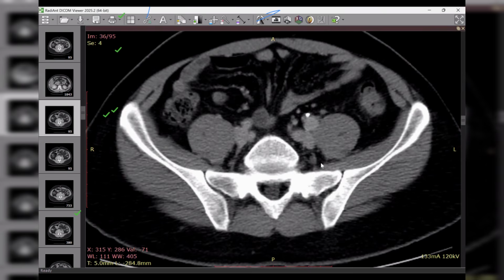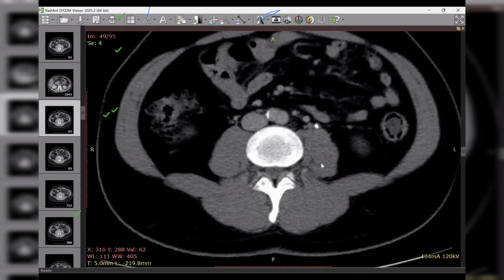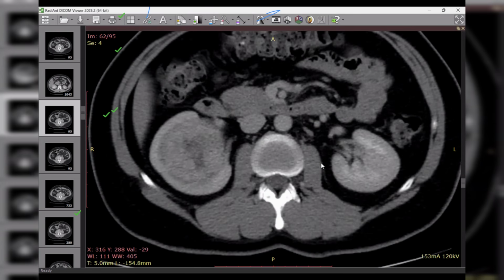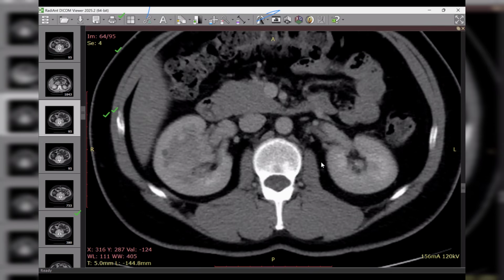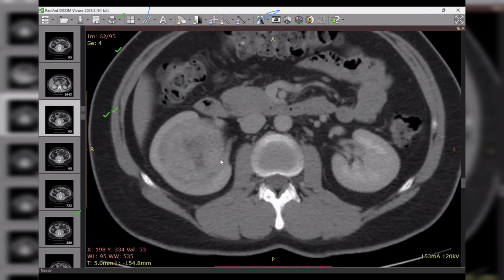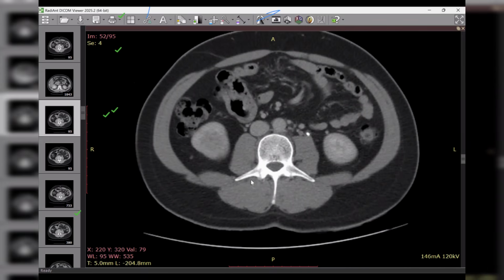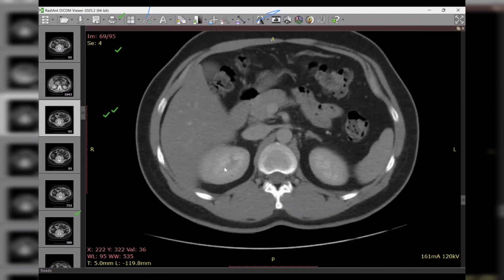To be systematic, you already took the right-sided mass lesion, described it very well, commenting on the arterial system, venous system, then the delayed or pelvis system on the delayed image. Then you went to the perinephric fat planes, very good. Then you searched for loco-regional lymph nodes, right? Then you went for distant metastasis, right? Any accidental finding.